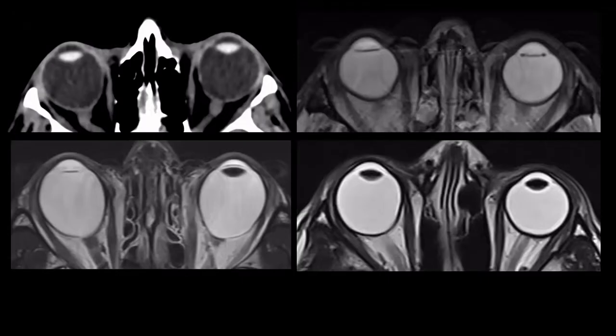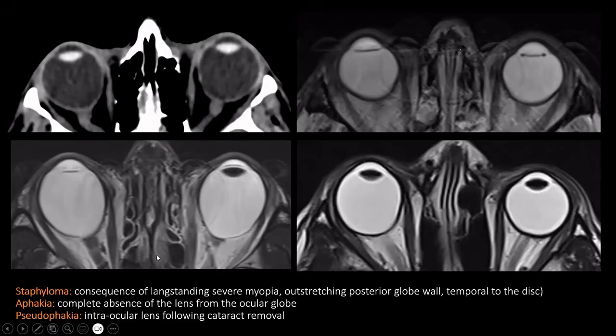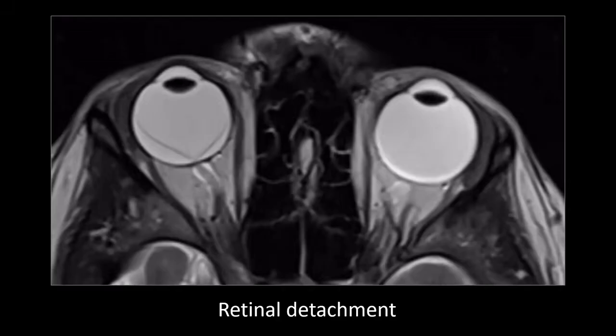And here are some other examples, and you see this quite frequently, especially in the older population. Several patients with myopia or with staphylomas rather, and some of them also with intraocular lens implants, which is also a very frequent incidental finding. If the lens is completely absent, we call that an aphakia, but I have no examples of that to show you in this presentation. Let's talk about detachment.